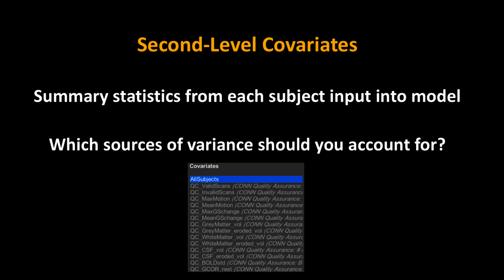I believe that I included a sample covariate in the hard drive, but there's also a download link to download this sample covariate that we'll play around with. It's a very simple format, so no matter if you're looking at age, what are some other ones? Help me out here. What are some other second level covariates? Gender, height, I don't know. It's just whatever you have. You can input that as a covariate.